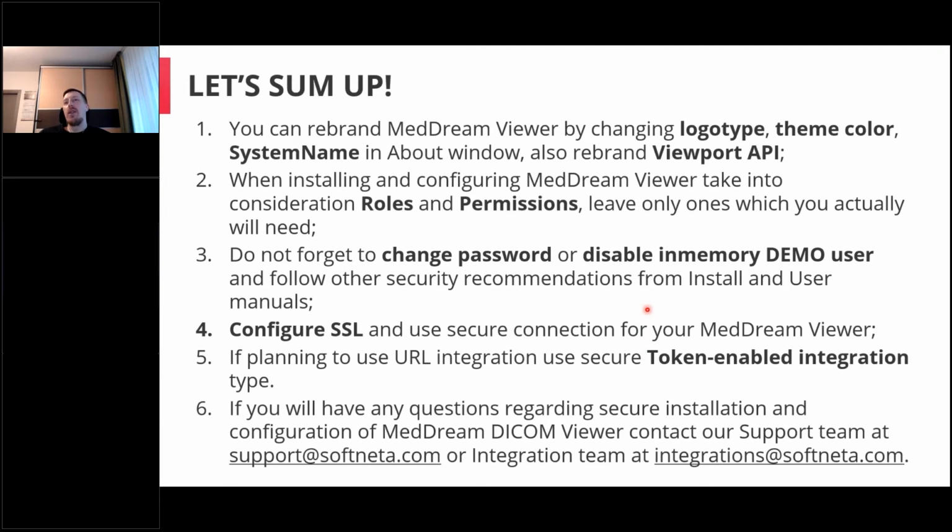Also, when you are using MedDream, do not forget to configure and use a secure connection. So configure and use SSL. And if you are planning to use integration, we really recommend using the token enabled integration, which, as you saw, has much more functionality, you can control many more things, and it is much more secure.